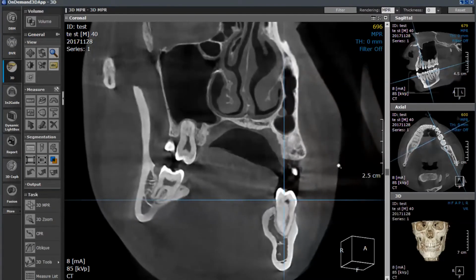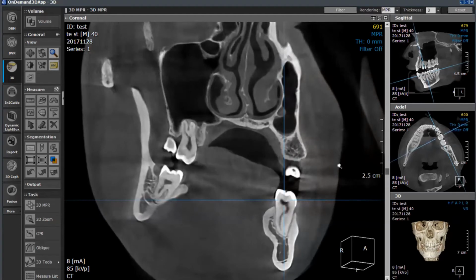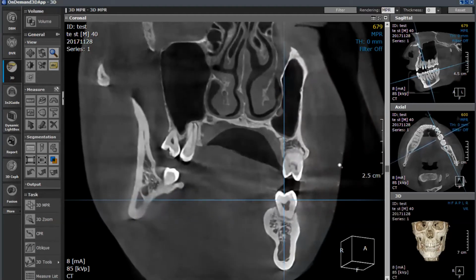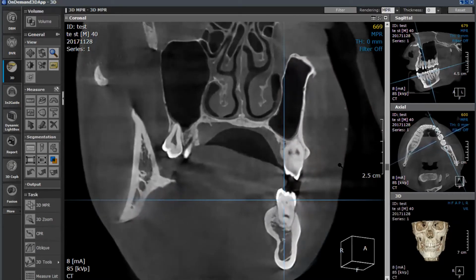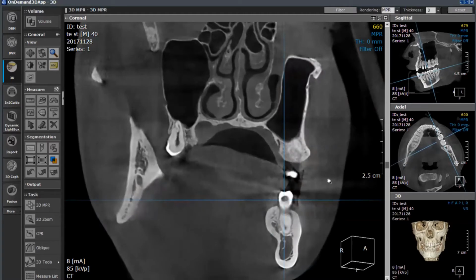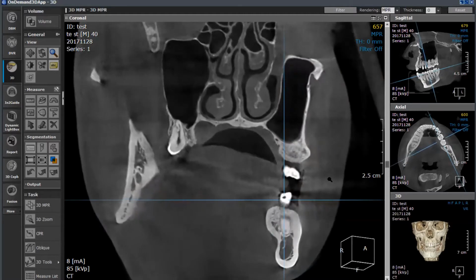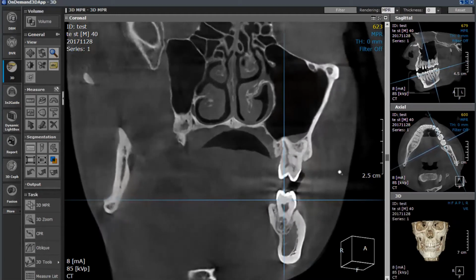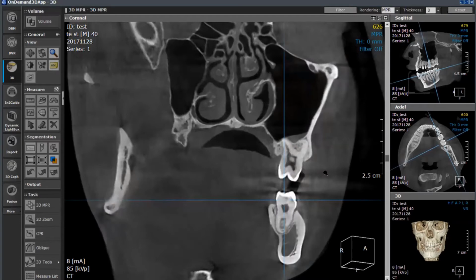We're going to look through there as well, be able to see from a mesial distal perspective. And as we move more distal, you can see that that cavity is going to start to show up right about there. And then we're able to move it all the way through to where we can see the break in the crown as well. So as we go through, again, this gives us the ability to evaluate from a buccolingual to mesial distal perspective.